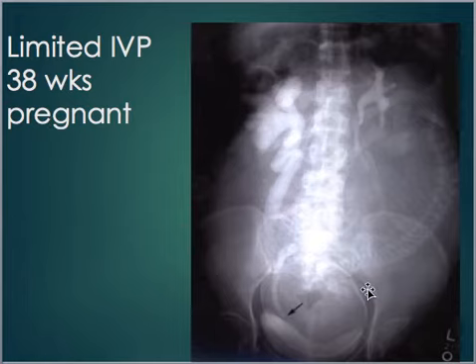So you can see here the head's down, and you can see the spinal column here on the baby. Like I said before, we will perform procedures on women who are pregnant if it's absolutely necessary. You can actually see how the bladder is kind of smushed down here from the head putting pressure on it. But obviously this needed to be done. This woman's got an obstruction.